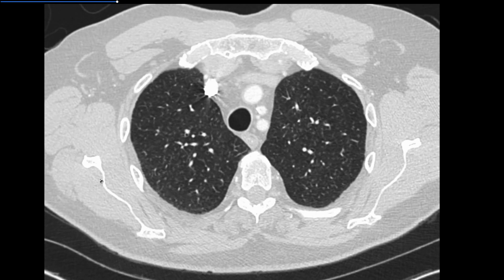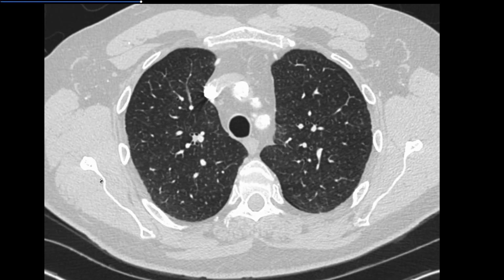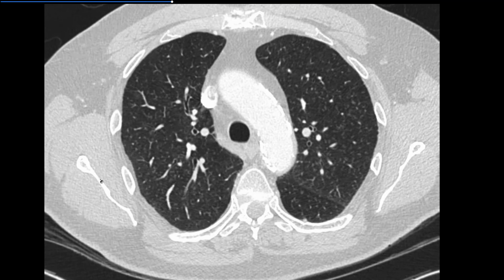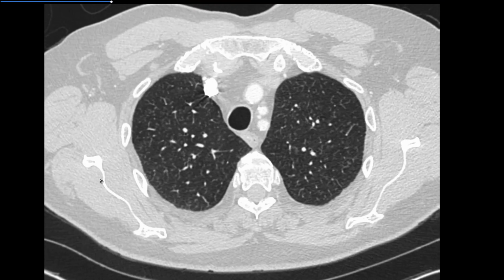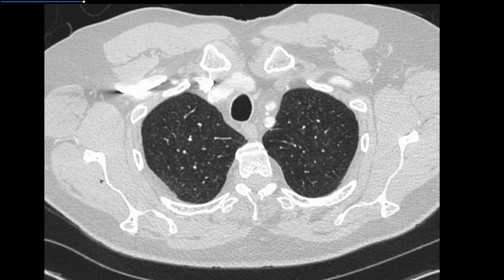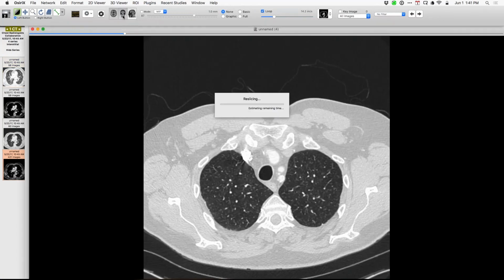Anyone think that is all right or unreasonable as a provisional clinical and imaging diagnosis? I think it's the best diagnosis. Yeah, that's pretty nice. It's pretty florid, isn't it? I mean, I see it sometimes kind of subtle, but yeah, that's pretty. A little bit sharper. And what's also nice is that with HP, besides that they're symptomatic, it's much more diffuse. And these, like you said, can you make a coronal to show the distribution? Yeah.